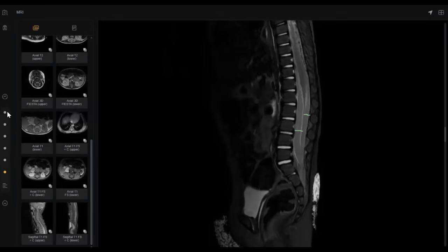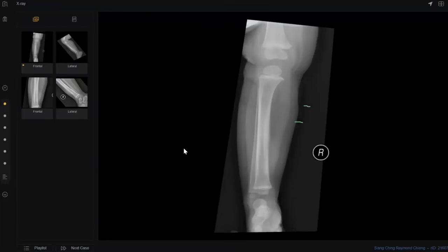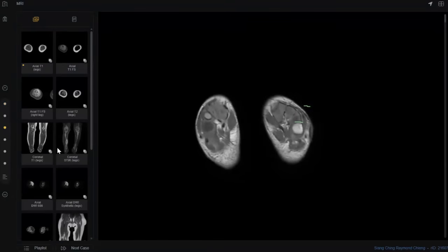What happened here, my colleague? Case, very long case. Start from X-ray, and the examiner gives a very misleading history, trauma. But there are periosteal reaction and sclerosis here. Then finally we end by drop metastasis. What happened? It was an Ewing sarcoma.